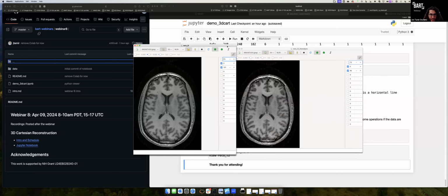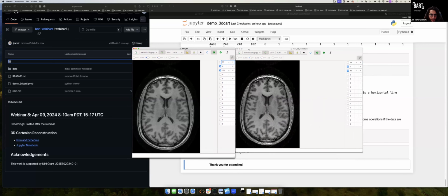Now, I did intend to, but I didn't have a chance to really prepare well for it, so I didn't want to do it half finished. But I think it's also important to discuss what you do with the image after you reconstruct. If this is just for a paper, then you're probably done at this point. But if you're working with clinicians, then eventually you want to load this back in as a DICOM so that they can compare it to some other standard scan that they run.